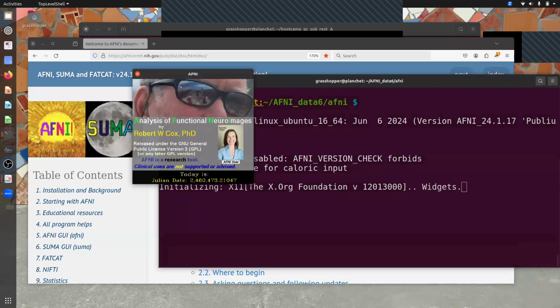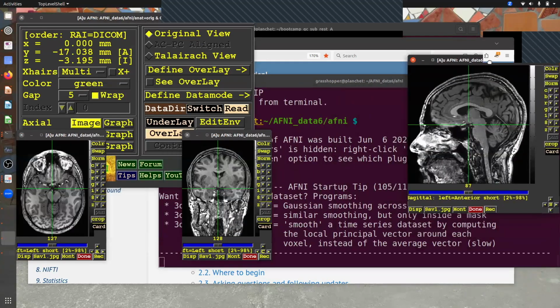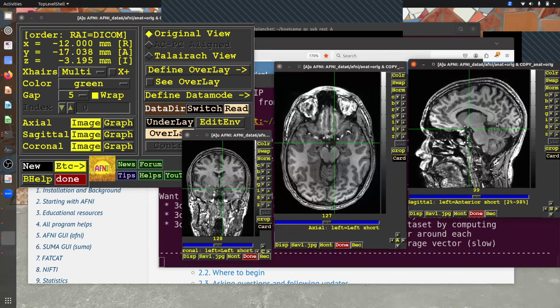So generally, whether you're doing a lot of fMRI analysis or any other kind of project, it's always good to look at your data first and get a sense of what you're going to be dealing with. One of the first things that we look at when we're processing fMRI data is an accompanying set of data that provides a structural image. This is what's called a T1 weighted anatomical.